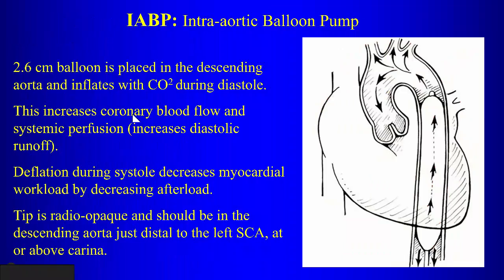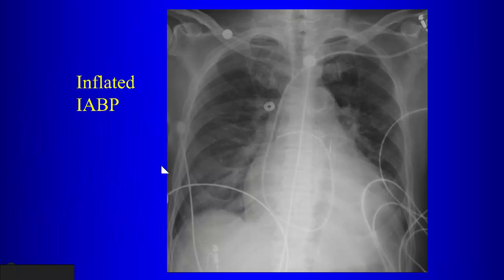It's filled with CO2, and it inflates during diastole, which is supposed to improve coronary perfusion, and it deflates during systole, which helps act like a suction to increase peripheral perfusion. That is the theory behind these intra-aortic balloon pumps. And here's another nice example of a balloon pump.